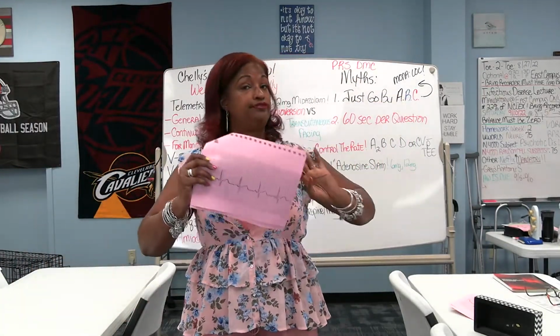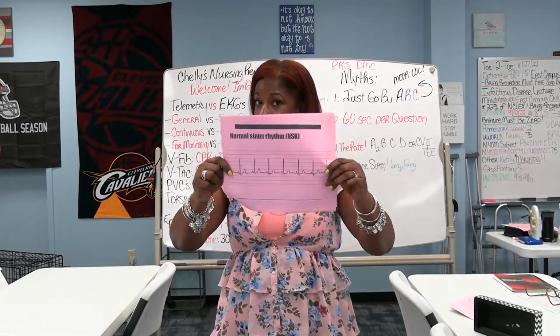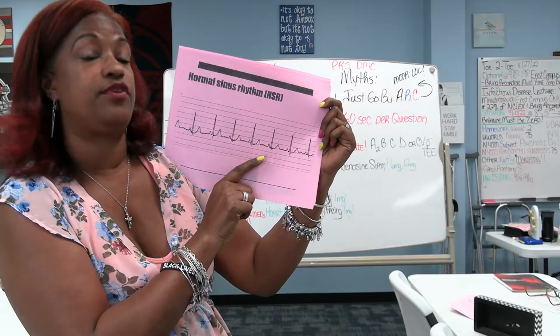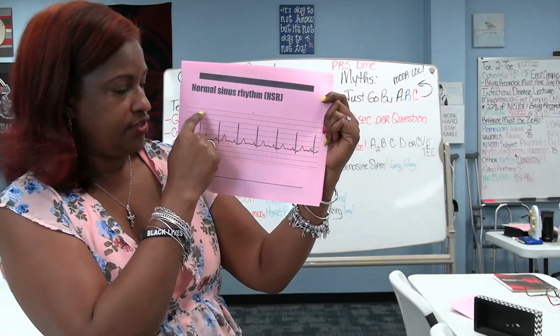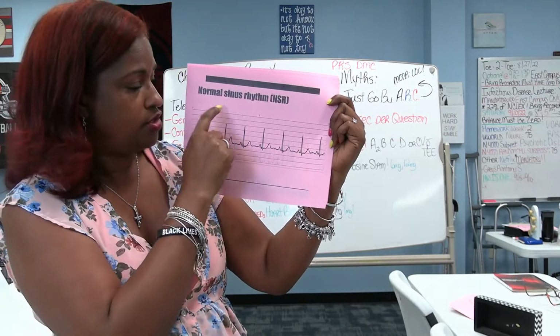Now, I'm gonna flip. Don't flip out over there. Here we go. Flip. So here you see another normal EKG, and on this EKG, it's even more accurate. And what's at the top? R's, right? Boom, boom, boom. How many R's? 1, 2, 3, 4, 5, 6, 7.